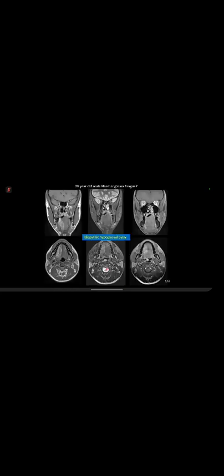And the concept is that when there is motor denervation, initially the muscles show edema. So they are high in signal intensity on STIR sequence and can show enhancement. In a subacute form, the edema subsides, and there will be fatty replacement. So there will be patchy enhancement, just like our case here. And in chronic, it will just become fatty atrophy. And this can happen in other parts of the body, by the way, the motor denervation.